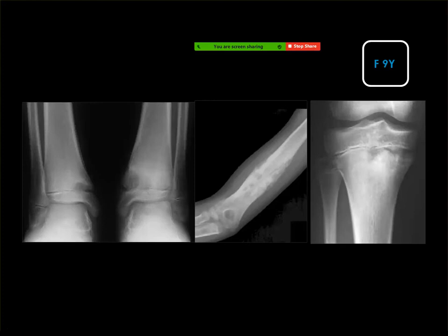The humerus looks like infectious osteomyelitis. Okay, but you should consider all as infection, because you don't say that the patient had inflammation of one lesion and another lesion is neoplastic. Sorry, what do you say? The other lesions I think are neoplastic, but the humerus I don't know. This sclerotic lesion? No, the humerus. The humerus is infection or tumor? I think it's neoplastic.